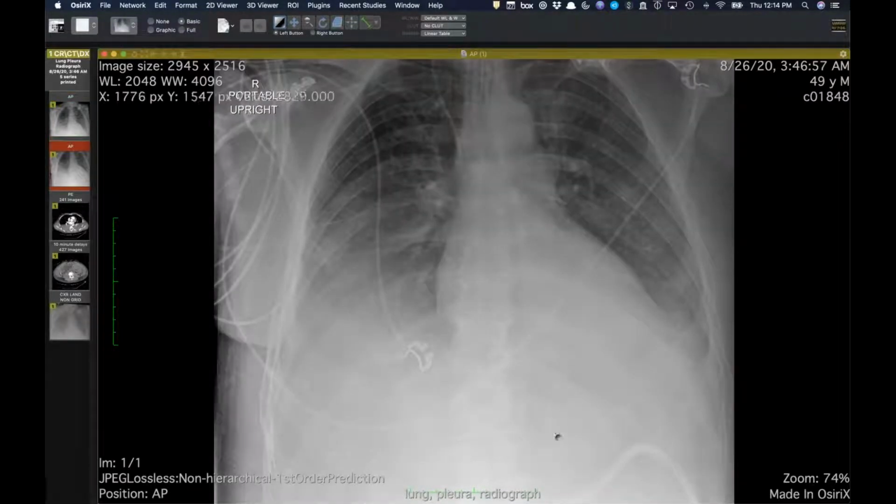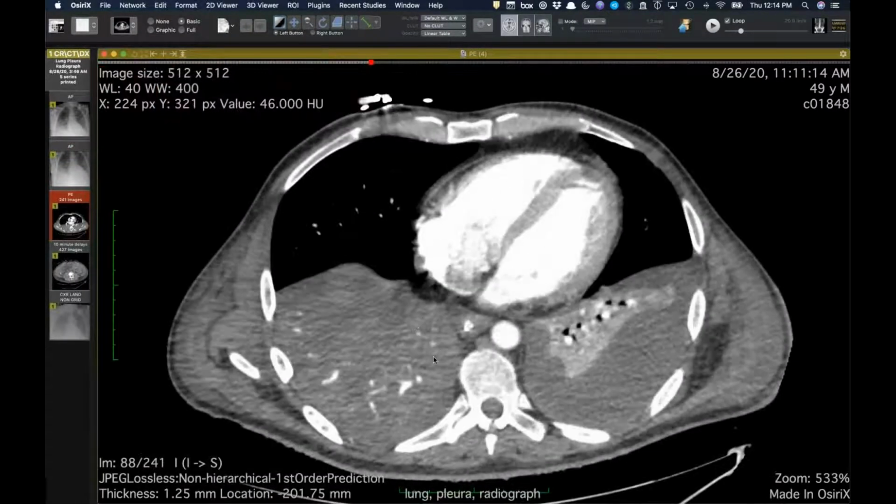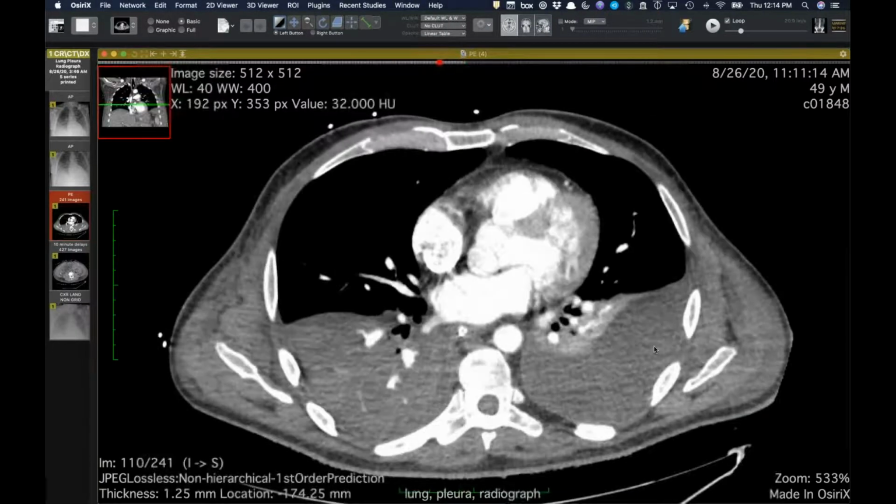This patient, as you can see, is intubated. They have necrotizing pancreatitis because you've got this kind of haze obscuring both hemidiaphragms, the left lower lobe socked in, so you've at least got some left lower lobe collapse. But this patient, I think this is a great teaching case. You'll see on the CT done at the same time, there's absolutely zero or close to zero fluid on the right.